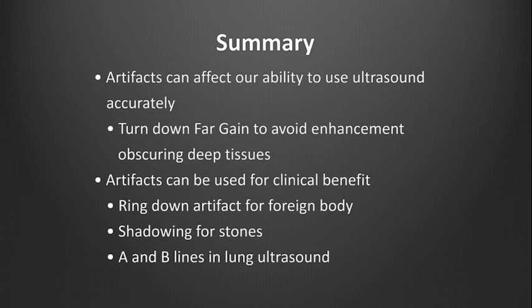Artifacts in ultrasound can be mistaken for pathology or obscure pathology, and it is imperative to avoid these pitfalls. We have reviewed several common ultrasound artifacts, the underlying physics involved, and techniques to recognize the artifacts, and in some instances, use them for clinical benefit.